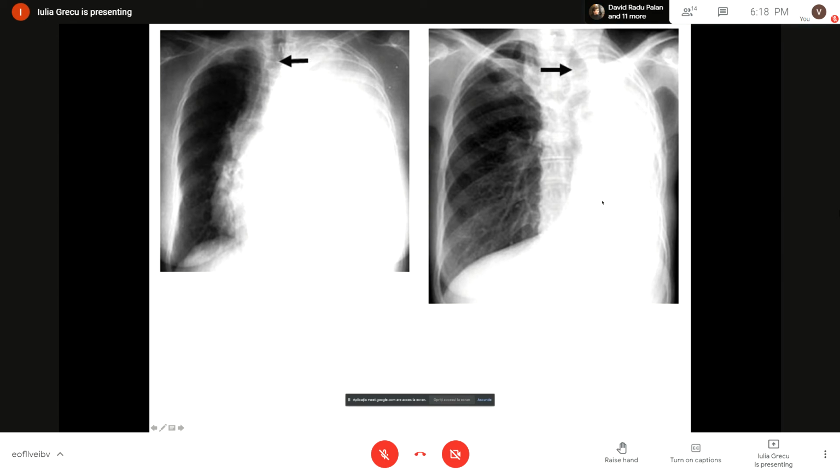Here, where the lung is completely collapsed, it looks like it tractions the ribs and pulls them close together, so the spaces between them narrow compared to the other side, and compared to this massive pleural effusion in which the spaces appear a little bit enlarged. Okay, so keeping this in mind, you should have no major problems identifying this kind of pathology. These are the major differential diagnoses that you have to make in the setting of a complete white lung.